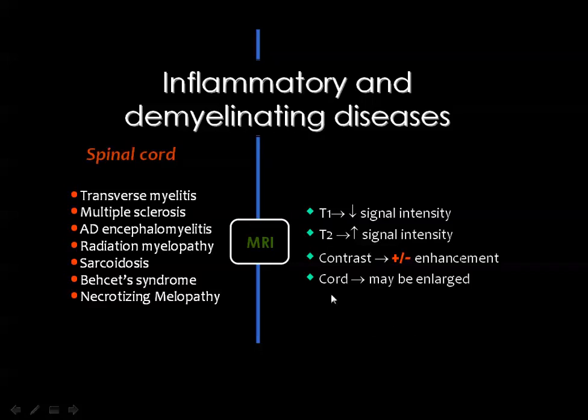Also, in some cases the cord is swollen, and in other cases the cord is not swollen and is of normal size.